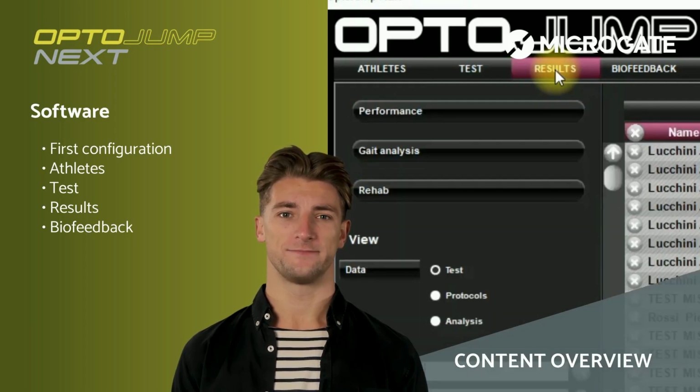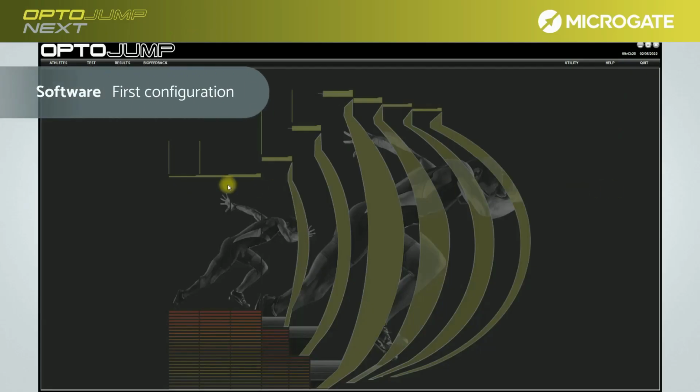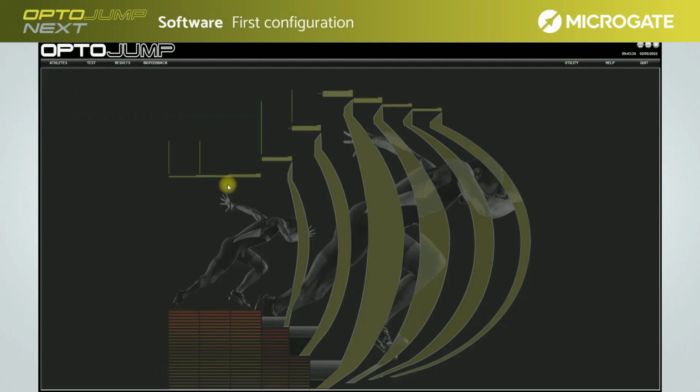Let's start. When the software opens, you are on the main screen. This is characterized by 3 levels of menus, one consecutive to the other. The first level is the selection menu at the top. Divided in 2 parts, it shows on the left side the index of icons that allow you to manage athletes, test, results, and the biofeedback, which we will see in detail later. On the right side are the icons for setting, configuration, and help.